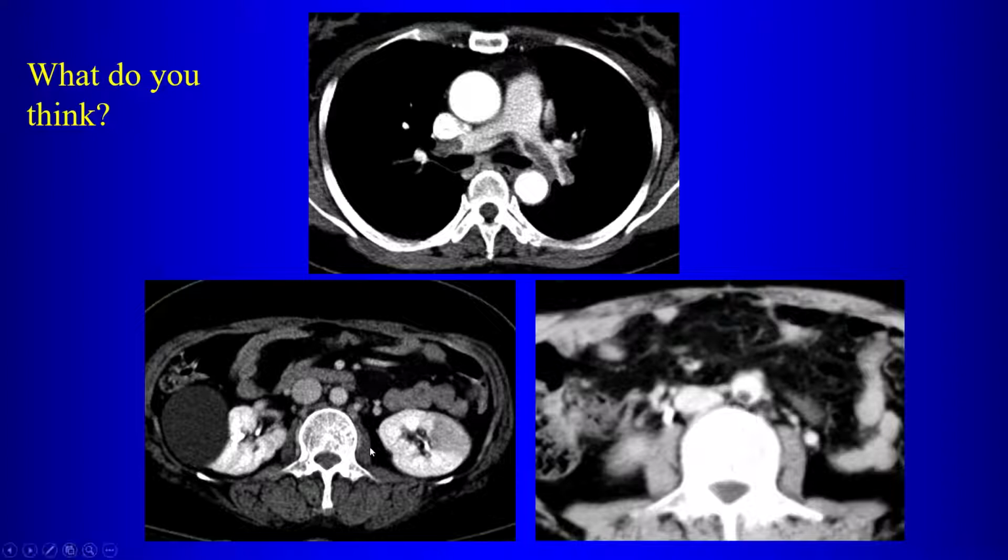That, of course, represents an infarct. And then when we look here, the more inferior aspect of the abdominal aorta, we see a filling defect. So there's a clot here within the abdominal aorta. So this patient has clot on the right side of the circulation, and there's evidence of clot on the left side of the circulation, resulting in an infarct here in the left kidney. So this represents paradoxical embolism.